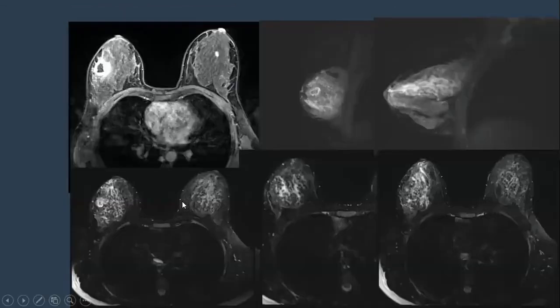Let us see. This is the MRI. Okay. This is the index lesion. It seems to be here. Because in mammography the breast is mobile, sometimes the lesion moves 1 or 2 hours or even 3 hours when compressing, from the exact origin of that lesion.